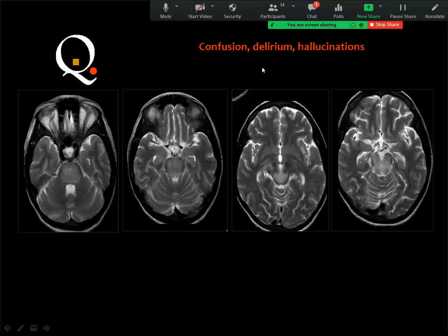This patient had confusion, delirium, and hallucinations.